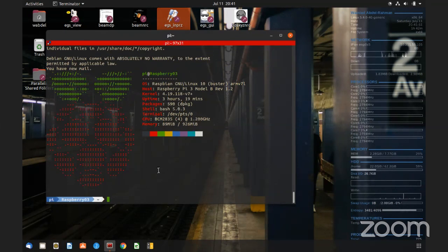In the past, parallel processing done with EGS just split the job. For example, if I set the split number to 12, it will actually make 12 jobs and submit them to each core, and the number of particles will be equally divided among the cores, so divided by 12. So if I'm doing, let's say, 12 million, each core is going to calculate 1 million.